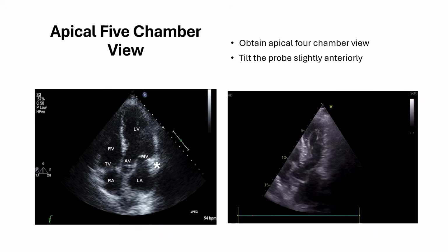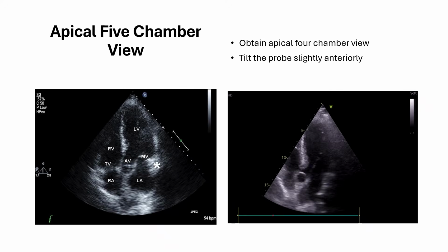So you see slightly different left ventricular walls compared to a standard apical 4-chamber view. Next to the RV, you see the anteroseptal wall of the left ventricle, and opposite to the anteroseptal wall is your inferolateral wall. This view is quite good if you want to obtain gradients through the aortic valve and gradients through the LVOT, which you can use sometimes in order to estimate left ventricular cardiac output and index. Please pause the video if you need more time to review this slide.